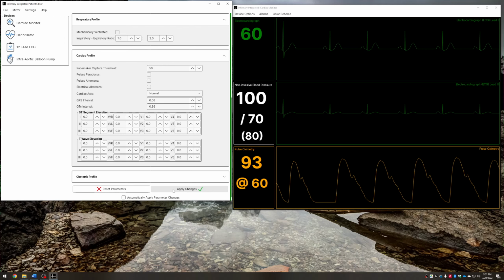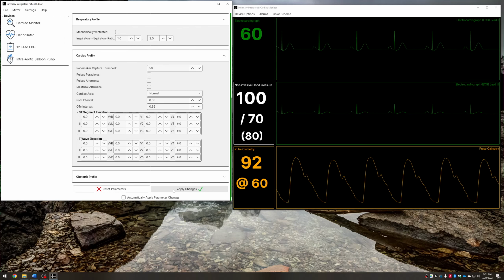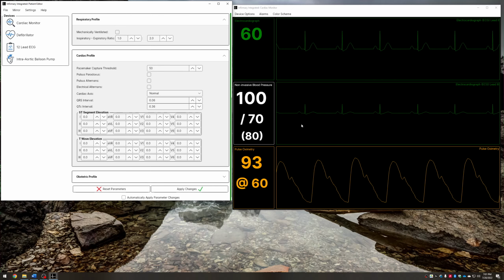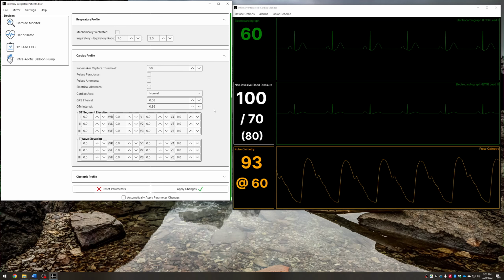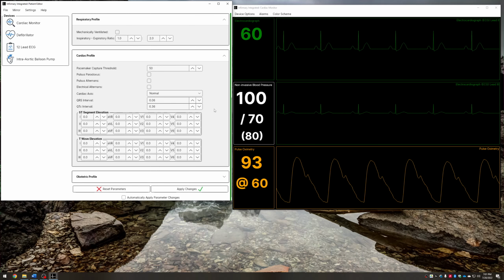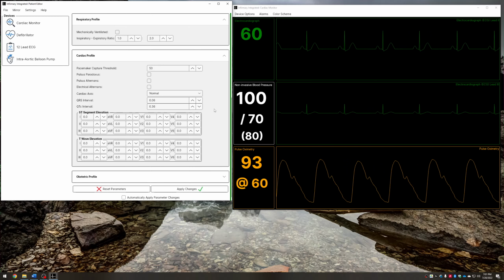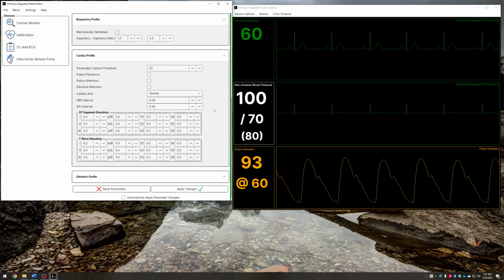Now the patient model is a digitally modeled patient. One of the major features of Infirmary is that we're not just showing you, on this cardiac monitor, a facsimile or a copy of some pre-drawn QRS complexes and waveforms. This is actually creating real-time waveforms.